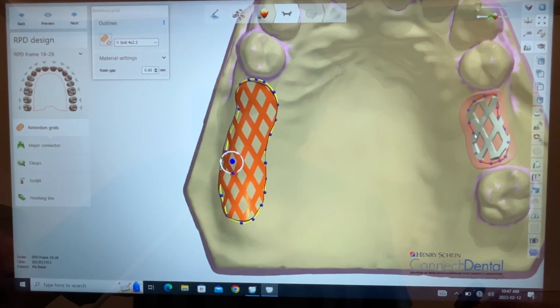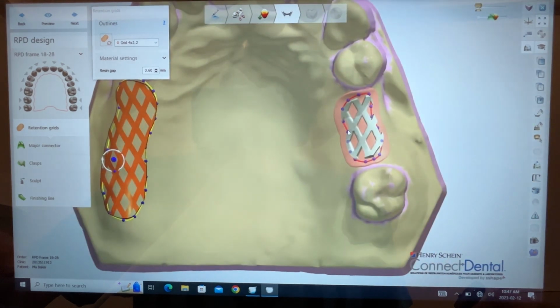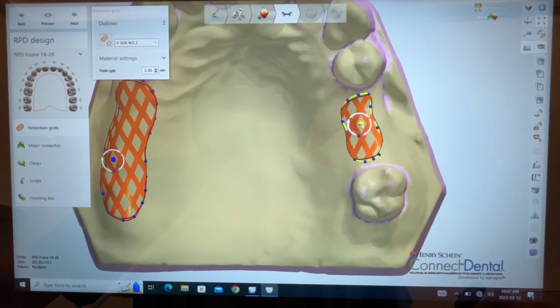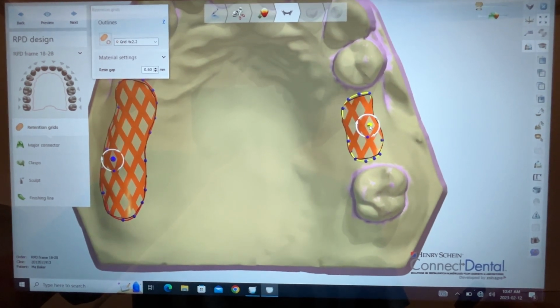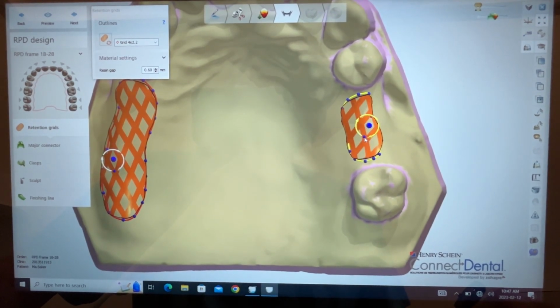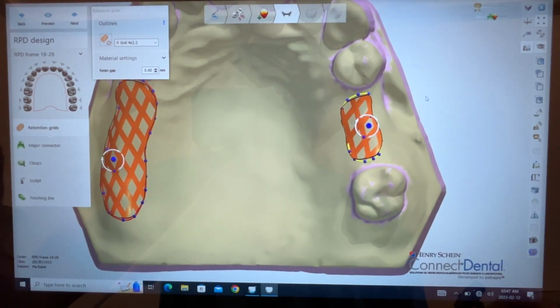Let's go over to this side. Can I do this side? There we go. So hold the dot in the middle with the left mouse button down, left and right. I can rotate it if I want. There we go. So I got this nice solid line here. It seems my diamonds are a little off skew going that way, but let's see if I can bring it back just a touch. Maybe move it out, bring it down. Oh, you could play endlessly here, goodness sakes.